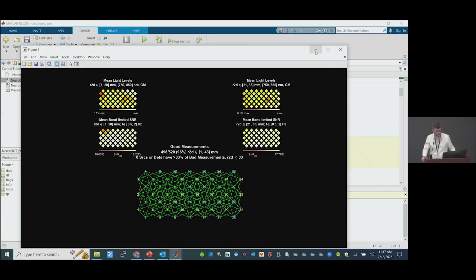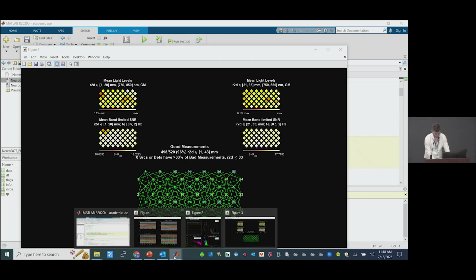That is a very good question. The question was, can NeuroDOT handle variable block lengths with jittered interstimulus interval? The answer is yes. The main thing you'll have to look at is the info.paradigm structure. You'll probably have to set that up yourself with all of your variable ISIs and block lengths, but as long as it's specified properly within info.paradigm, it will show the appropriate vertical lines on our data quality figures.